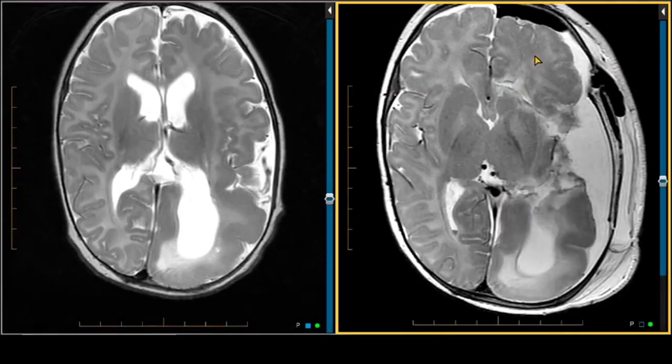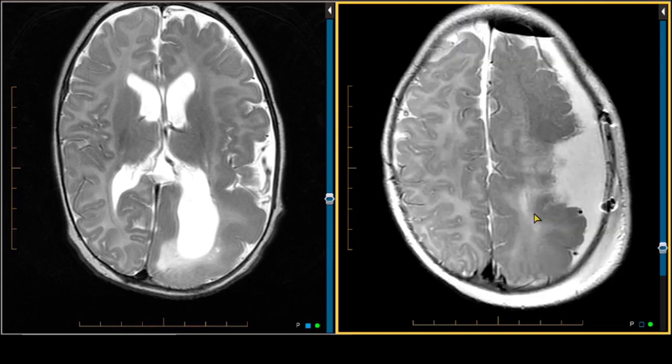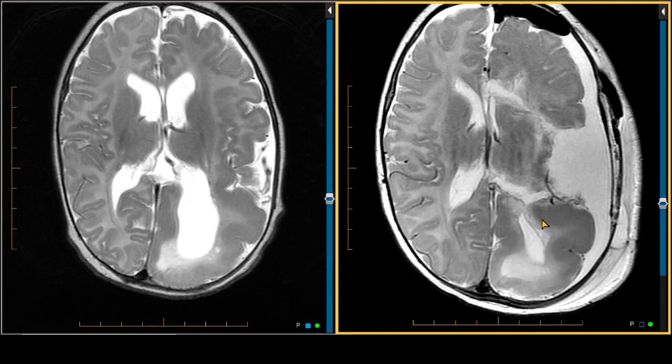transected. So the remaining portions of the left frontal lobe and left occipital lobe, as well as up near the vertex, the left parietal lobe, while they remain present, they do not have the ability to have seizures propagate to the right cerebral hemisphere or the working cerebral hemisphere. There's a few things to be aware of in this.